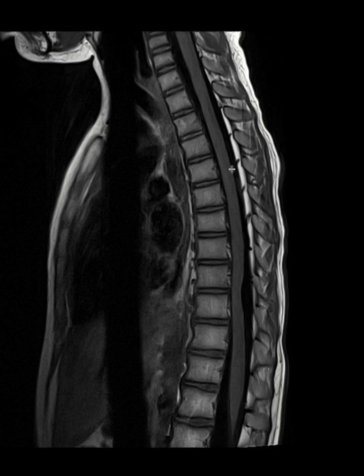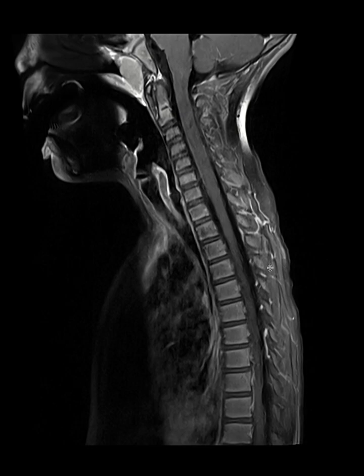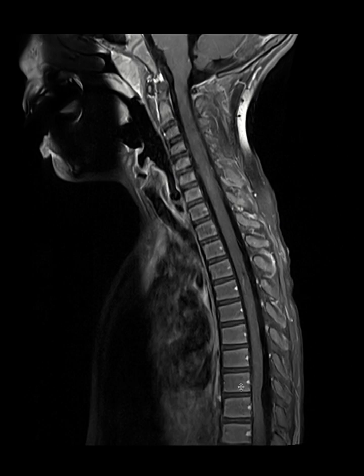This is T1 because the CSF is dark and the fat is bright. Again, there is a smooth indentation of the posterior aspect in the same area, but now it's T1 dark. So basically the lesion we are dealing with is all iso-intense to CSF. Now we have to look at the post-contrast. This is another thing we have to check, whether the lesion is enhancing or not, in order to make a good differential diagnosis.